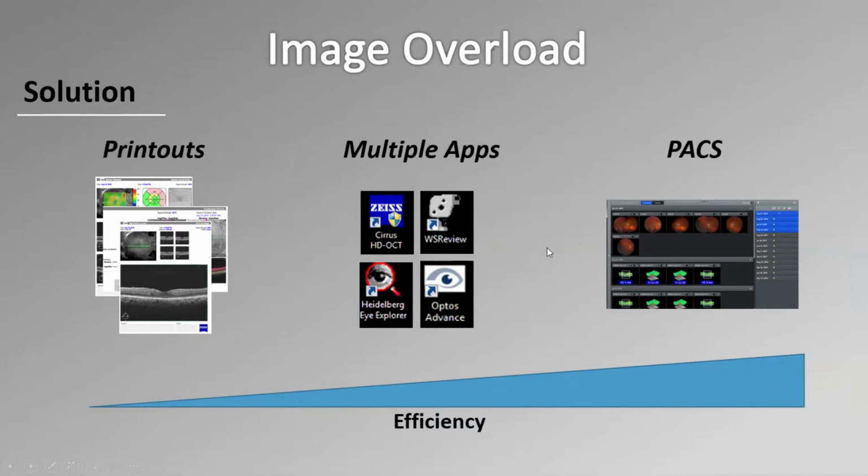So at this point, I think really the gold standard for image review is using a PACS system, which is really a comprehensive image review solution in which all the patient's images from all devices are stored in a single location and are reviewable and able to be interacted with within a single software solution.